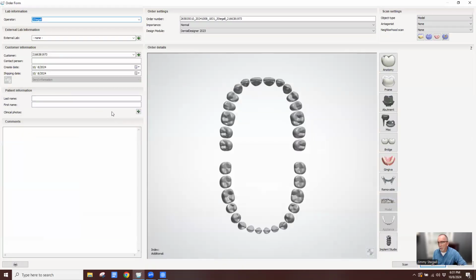The copy denture workflow is one that's used if the patient says, I'd like a new denture, but I'd like it exactly like this one. Or if the patient says, I'd like a copy or a backup. Those are the two most common ways for copy denture workflow.